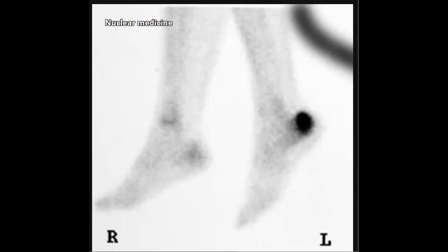So in such case, I think everyone will be happy that he will say some differential diagnosis, keeping with this lesion. So what do you think? What is your differential, most probable diagnosis in your mind? Do you think that it could be inflammatory, could be neoplastic, it could be, as Dr. Saad, Dr. Suwailam said, yes, stress fracture, one of the nice differentials here.